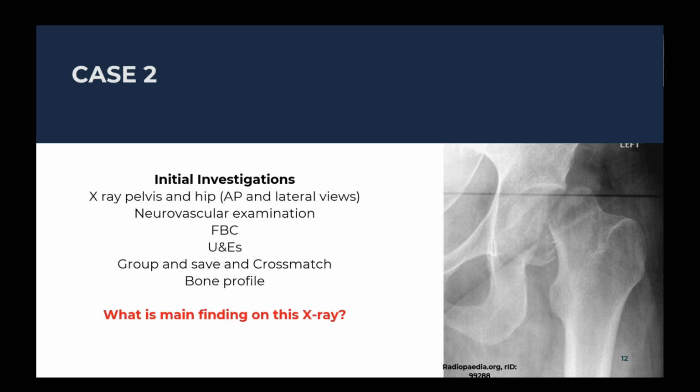Trauma hip X-ray, may not look quite optimistic. Yeah. Is there a dislocation? Yeah, there is a dislocation. Okay, let's look at the answers.